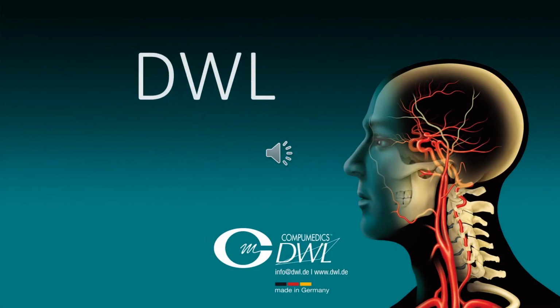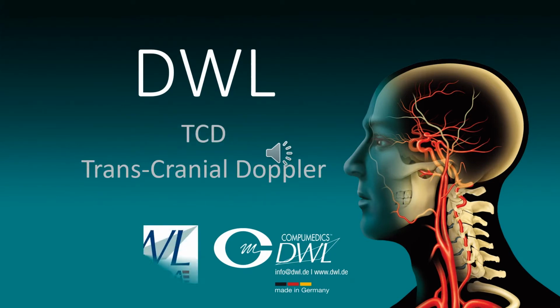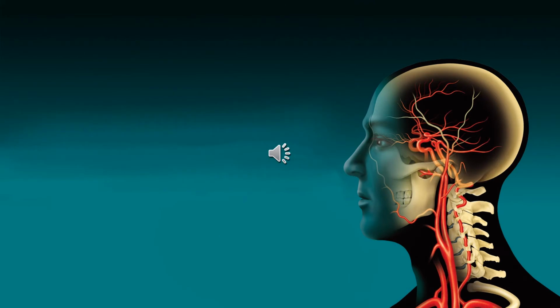These next couple of videos are going to go over how to use the QL software and how to set the options the way you want them to be. How to start your QL software.